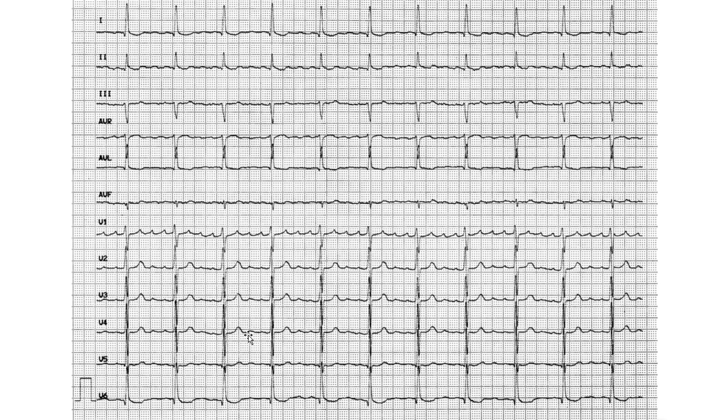5 or 6. To be honest, they won't really mind so long as you have logic and evidence to back it up. It will give you roughly about 250 to 300. That's flutter range. So you say flutter, and then you don't calculate the PQ interval, of course. Okay, do you get that?